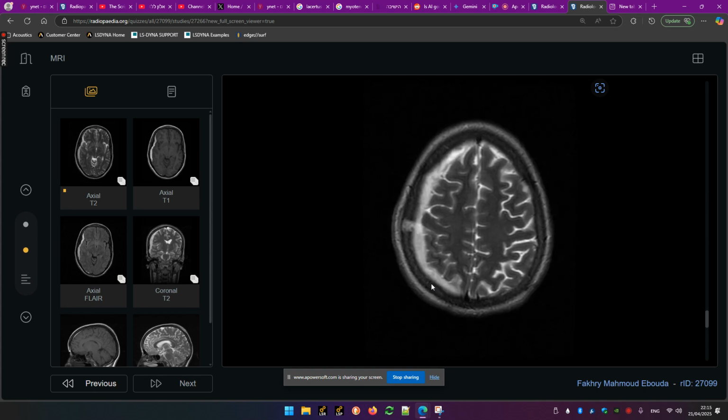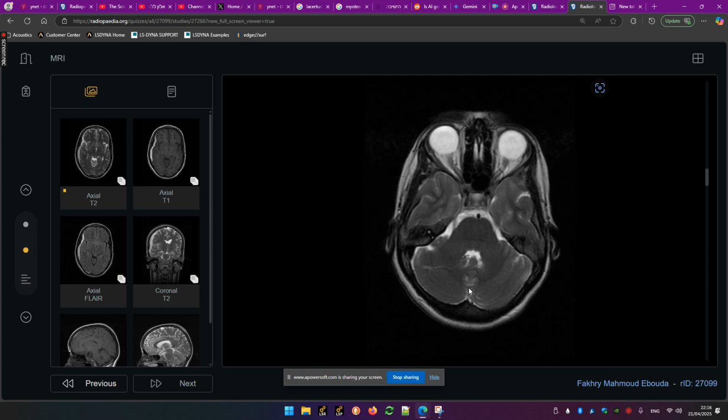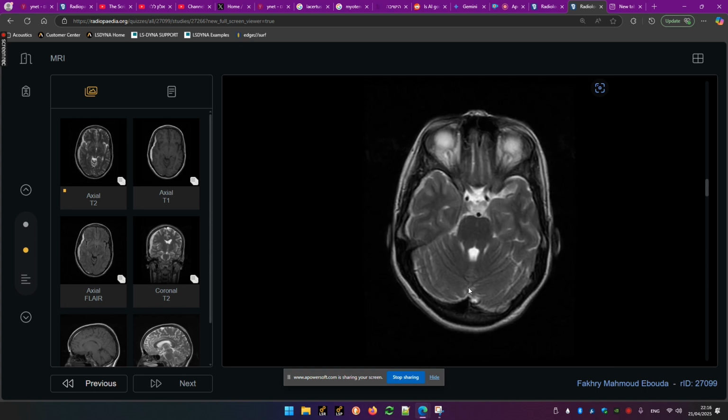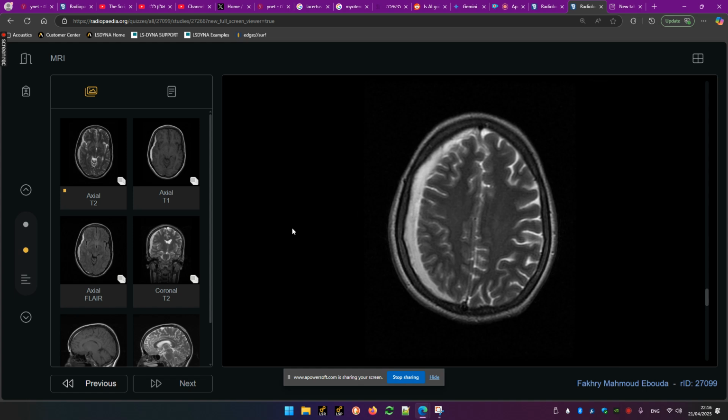It's the classic look of a subdural hematoma with a midline shift. Probably she's going to herniate if she didn't already. I think she will probably need a burr hole and reversing of the anticoagulation. That's what I think. Of course, I'm not a neurosurgeon, and a neurosurgeon will know much better than me, even though we just walked through the case from Radiopedia.